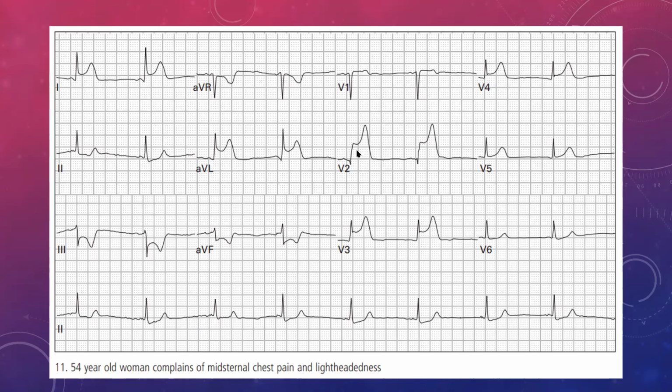So whether you said moderate or severe, that's excellent. If any of you had said mild, I would have been a bit worried because this is definitely a severe one. Now, these are close to being the most severe ones that you can get, and the ones that anybody should look out for are what we call tombstones, tombstone ST elevations, which kind of look like that. So you may get a QRS complex, but then you get something that looks like that. Sorry, I had drawn it a bit badly over there. So these are the most severe ST elevations that you get.